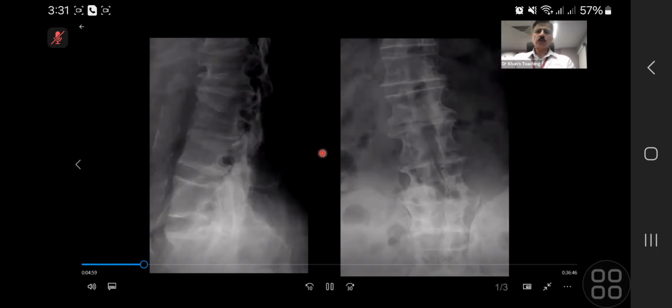So what is your conclusion? So in summary, there is posterior vertebral body scalloping and likely a secondary deformity in the alignment of the lumbar spine. My differentials for this would include a neural-based pathology such as neurofibromatosis.